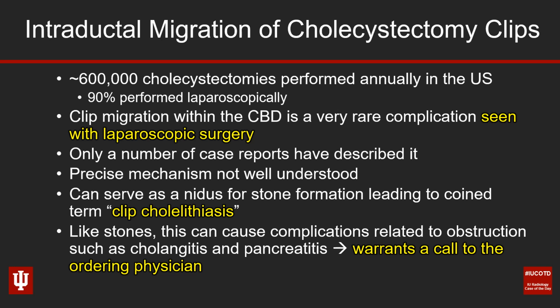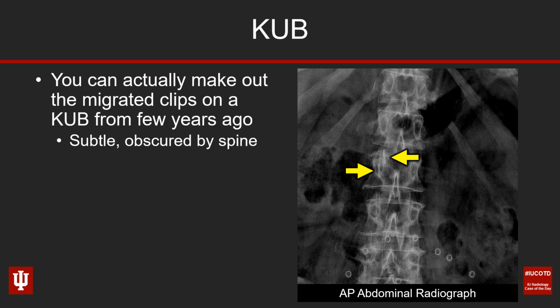So like stones, these clips can cause complications related to obstruction, such as cholangitis and pancreatitis, and this warrants a call to the ordering physician. On this less remote KUB, we can actually appreciate the cholecystectomy clips within the mid-CBD.